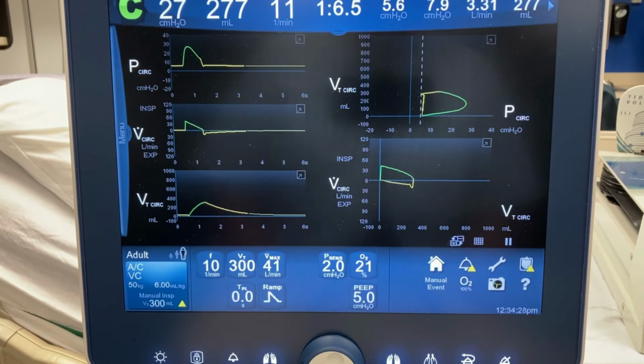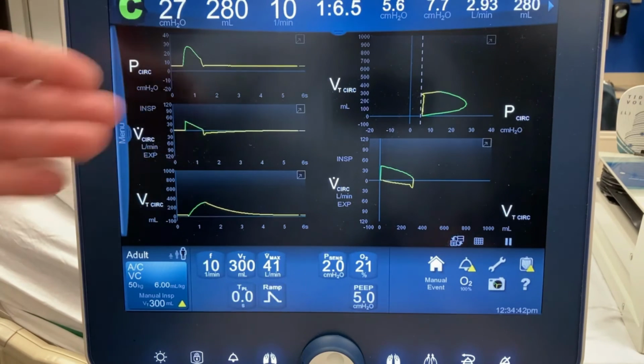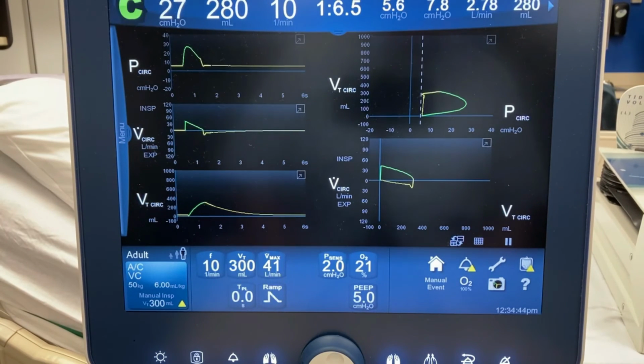They're getting all their volume, and I always knew then it was an air hunger issue, because they're pulling the volume that the ventilator's delivering, but because they're pulling it so fast, so hard, they're actually pulling pressure out of the circuit and creating a low pressure alarm.